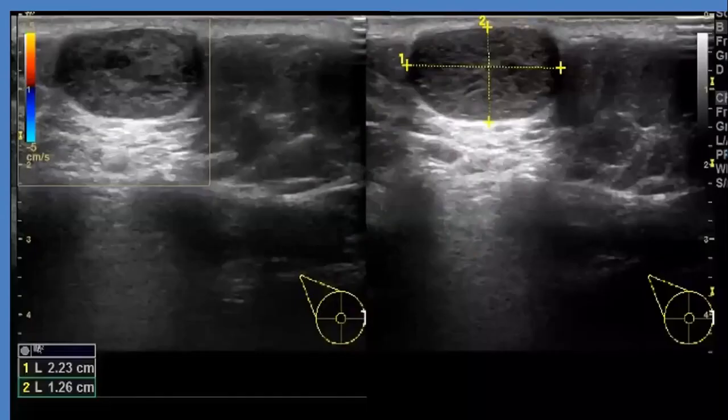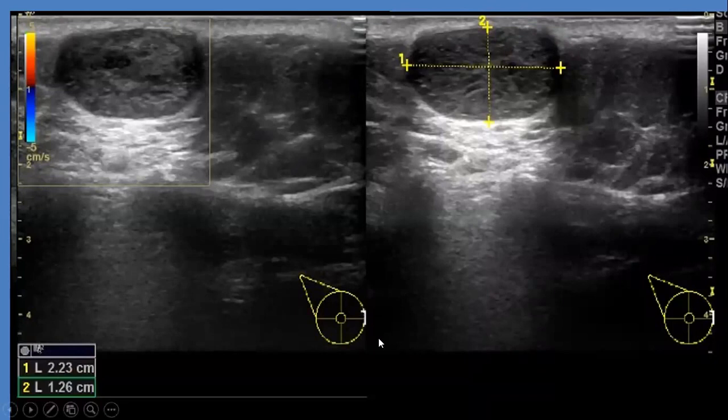This is ultrasound. Look for the extreme medial location. Excellent. You describe a 3 o'clock, but extreme medial.